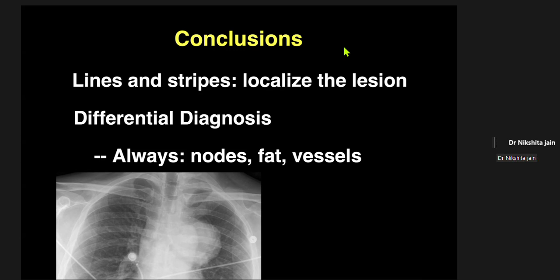The other question is that sometimes there are focal humps in the dome of the diaphragm. What do we usually report it as? I don't even mention most of them. If it's a very prominent hump, then I will measure, and if I just have a frontal film, I can't tell if it's anterior or posterior. I will say elevation of a portion of the hemidiaphragm.